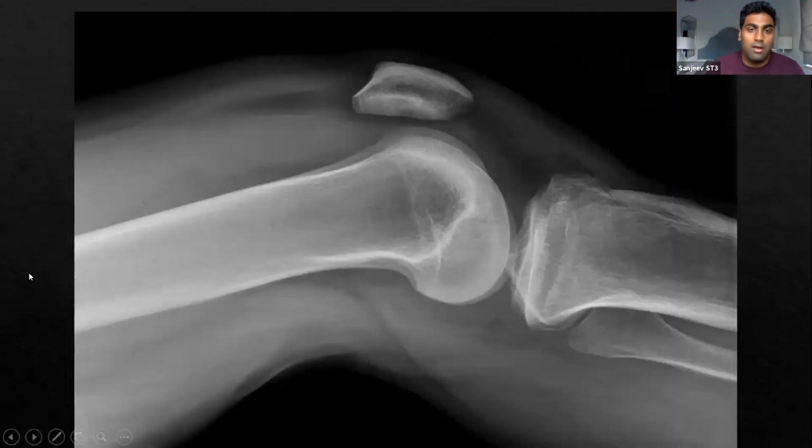Yeah, lovely. So there's no fracture here, or obvious fracture anyway, but can someone tell me what the abnormality on this one is? Another one that's worthwhile. So specifically, it goes back to what I was saying about looking for soft tissue. There were 2 things I mentioned. One was looking at soft tissue swelling. There was another entity, which is what this is.